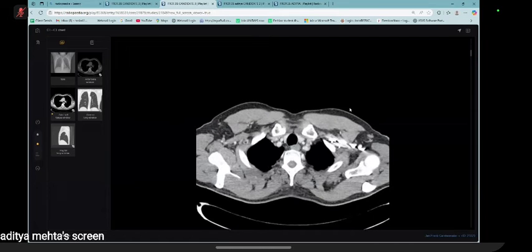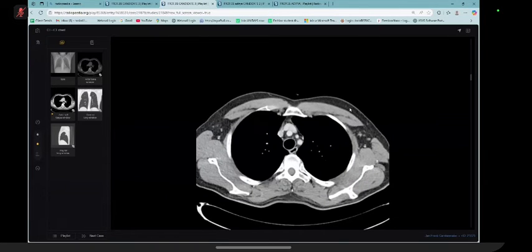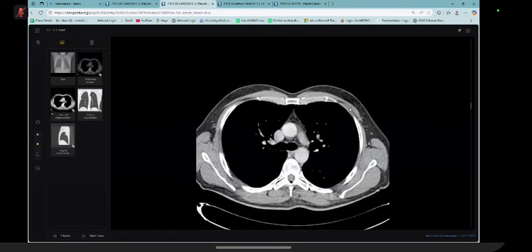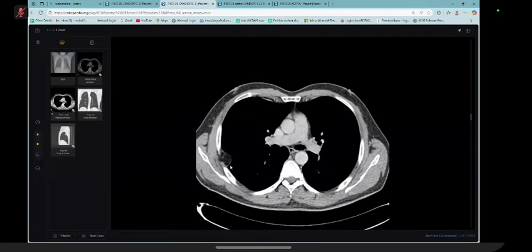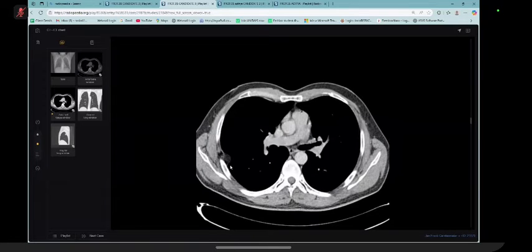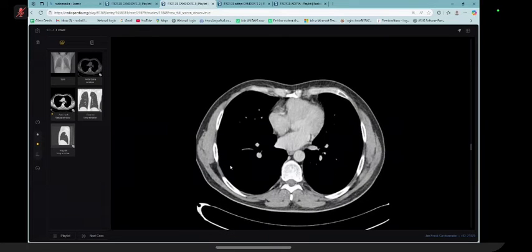This is the axial CT, mediastinal window, for the same patient. I can see the lesion that I noted on the X-ray. It's a pleural-based lesion with hypodensity. In my routine practice, I will check the Hounsfield unit. Maybe it's fat content. I will go through more to check if there are any other lesions.